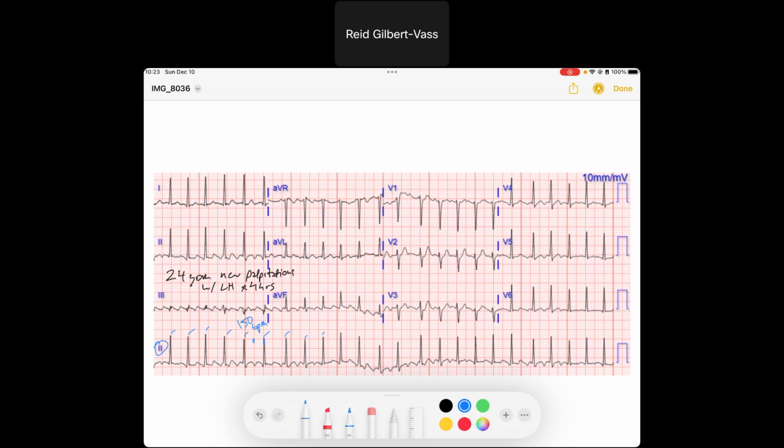It's tachycardia. So is this a tachycardia coming from the atria or the ventricles? Well, we've got these narrow QRSs. We know that if it's a narrow QRS, it's likely coming from the atria through the AV node and down into the ventricles, so the ventricular depolarization, this QRS aspect, is coming from the AV node, using the His-Purkinje system, which allows for the ventricular depolarization to occur in a short period of time and have a narrow QRS. So that kind of narrows down our focus.